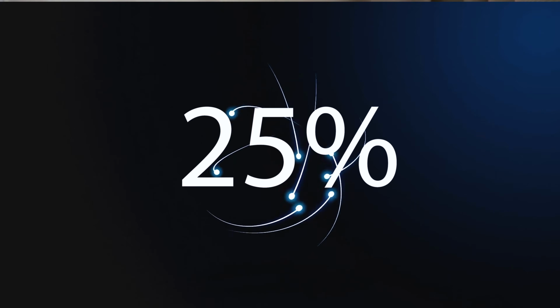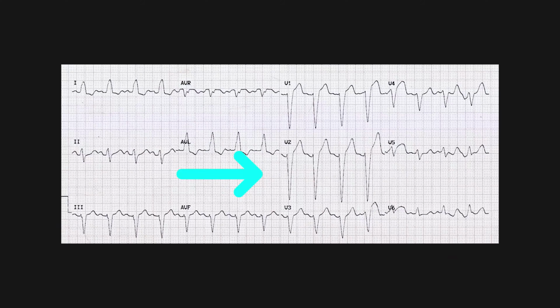So in the most layman's terms that I can find, your ST segment elevation needs to be big enough in proportion to your S wave. So if your S wave is massive, your ST segment has to be massive. And so it needs to be at least 25% of the size of your S wave. So you have your QRS, you look at the size of your S wave and then you look at the size of your ST elevation. And if it's 25% of your depth, because it will be negative because it's discordant, the QRS is going down and your ST segment is going up, if it is at least 25% of your S wave, then you have a positive ST segment elevation.